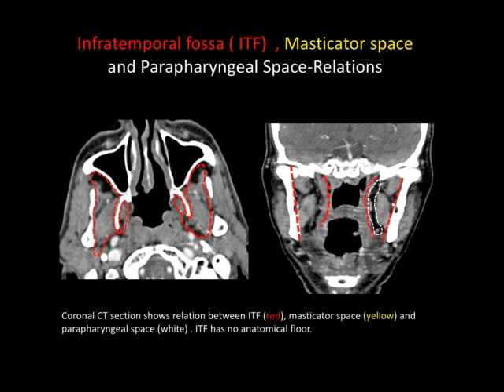Coming to the most important part, the second most important part apart from the pterygopalatine fossa, is the infratemporal fossa. I think by and large everybody should know this, and if you are in Tata, you should be the ones who, when you join some other center, teach people what the infratemporal fossa is in depth, and people should get mesmerized that you know the infratemporal fossa so well. It's an overhyped thing. I think it's just a very simple subject.